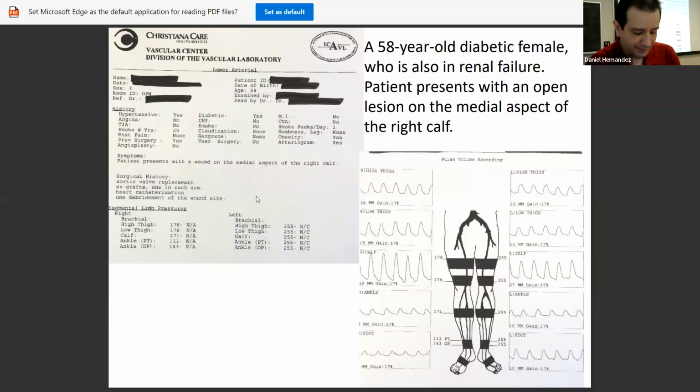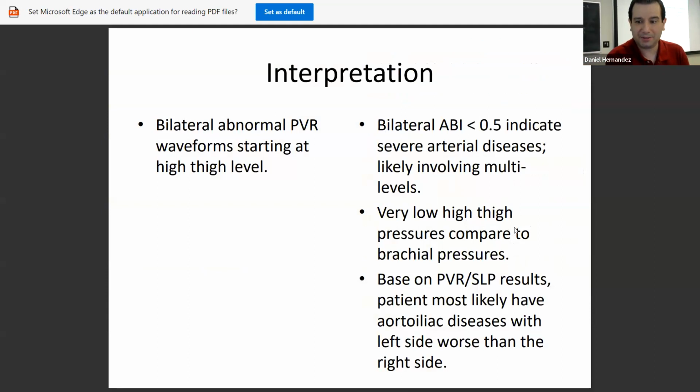This one's a little bit tricky. But we would want you to recognize that this patient has medial calcinosis because of their diabetes, that this side is all not compressible. So that's probably the disease that the boards would want you to recognize: the presence of that medial calcinosis.